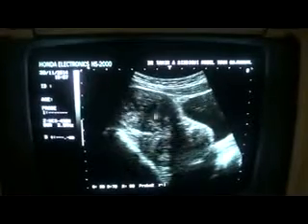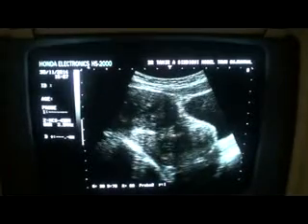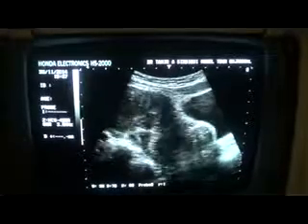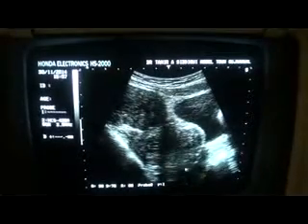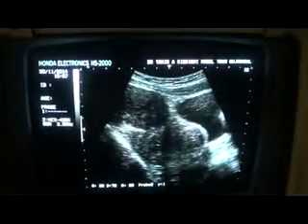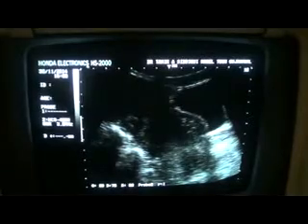This is the fundal one, this is the subserosal location, this is the uterus, anterior myometrium, fundal region myometrium, posterior myometrium, and here is the cervix, and this is the fibroid seen relating to the posterior lip of the cervix. This area is that of the cervix. This is the vagina. So this is our case of the day. Thank you very much.